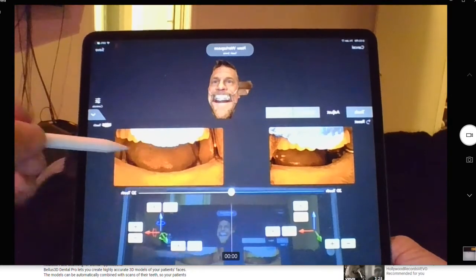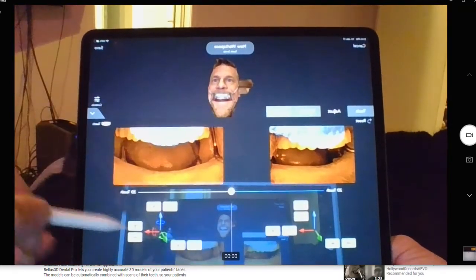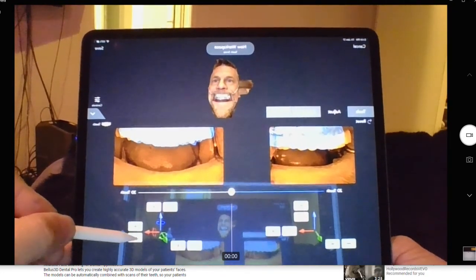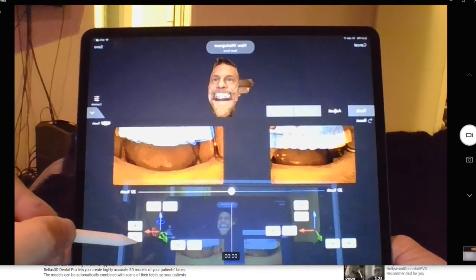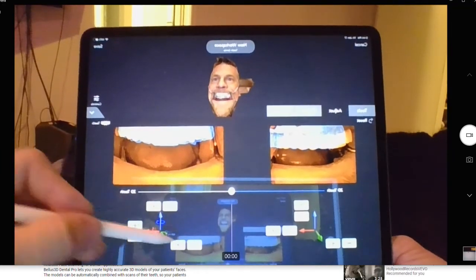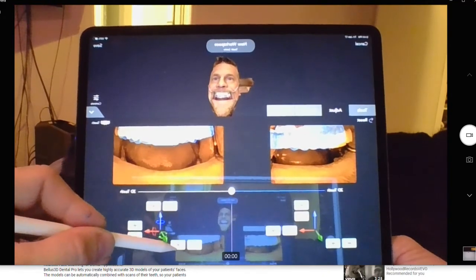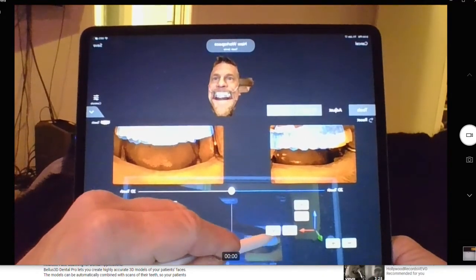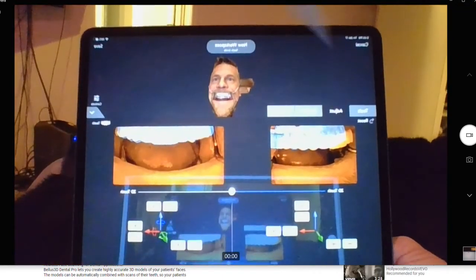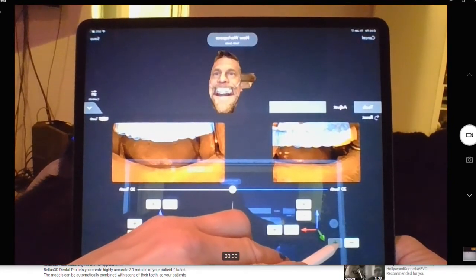That's good. And then let's see, I can see that I need to bring the back down a lot here. So that's the roll. So bringing the back down till it's level. Oh, too much. It looks like it's rolled a little bit. So let's make it level there. Looks like my midline got off a little. So I'm midline. Now I should raise it a little. So over here on this left one, I can see that looks like I need to go forward a lot.